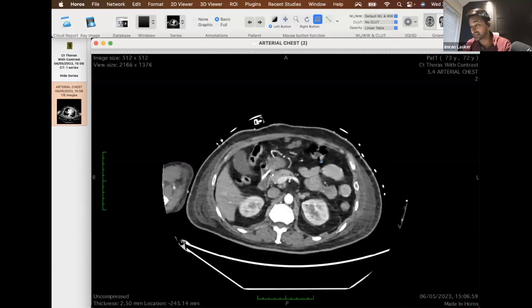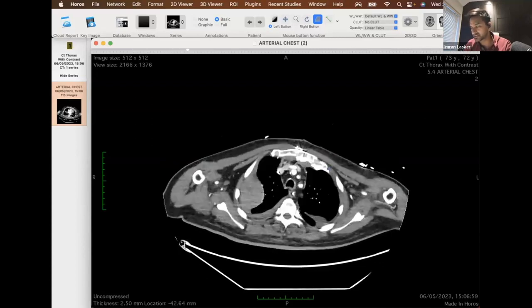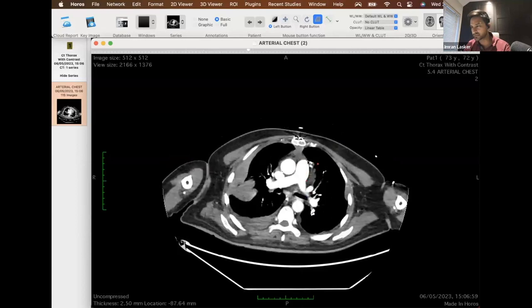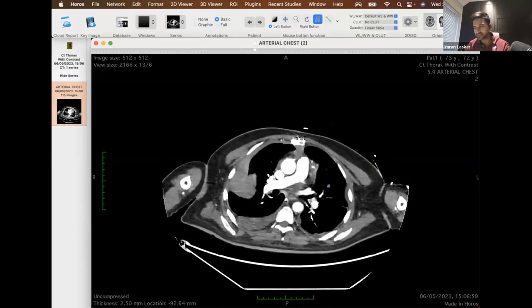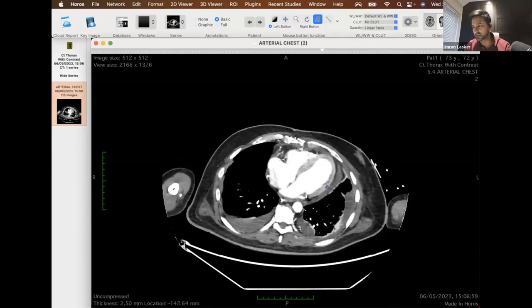So this is clearly a CT scan of an adult patient, and we can see that this is a contrast enhanced study because there's some contrast sitting over here that looks very bright and white. So that must mean that we're in what looks like an arterial phase, but also we've got a bit of contrast sitting within the pulmonary vessels as well. Sometimes you get a combination of the two. It's not because we've done a dual phase, it's just the luck of the draw.